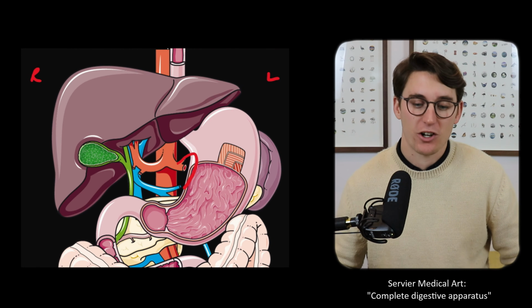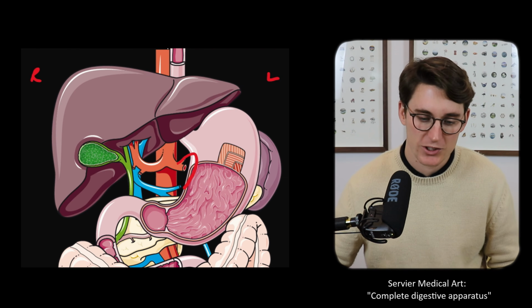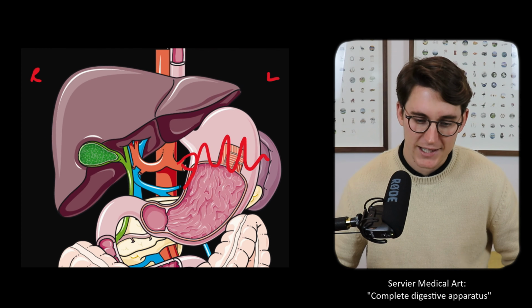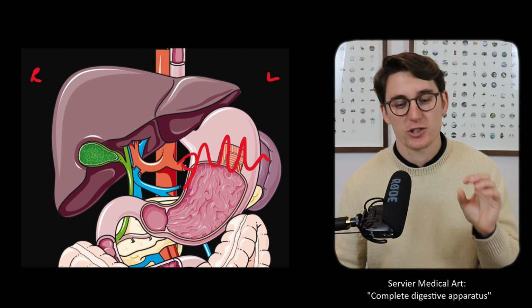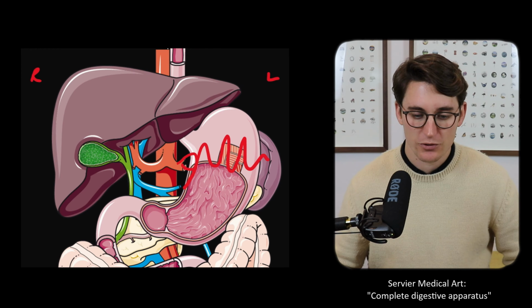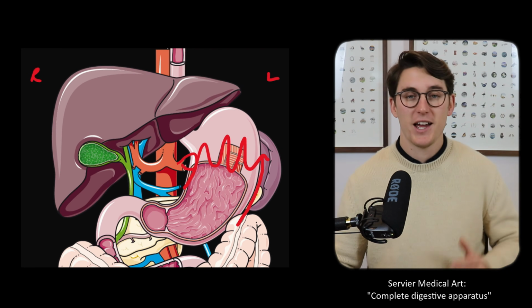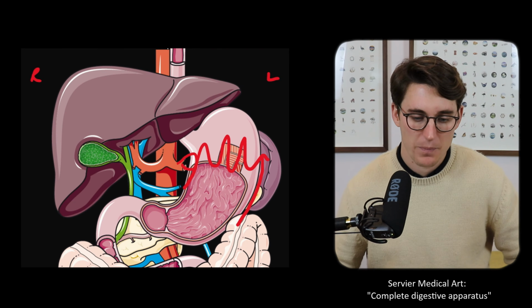Then we have our splenic artery, which will run posteriorly to the stomach, and it's this really tortuous artery, as you'll see just now. And that tortuous splenic artery heads its way off to the spleen. Along the way, it sends some branches down to the pancreas, pancreatic branches, and it gives off some short gastric branches into the stomach itself. Obviously, it supplies blood to the spleen, and it gives off a large branch here, which is our left gastroepiploic branch, and that is supplying blood to that greater curvature of the stomach there on the left.